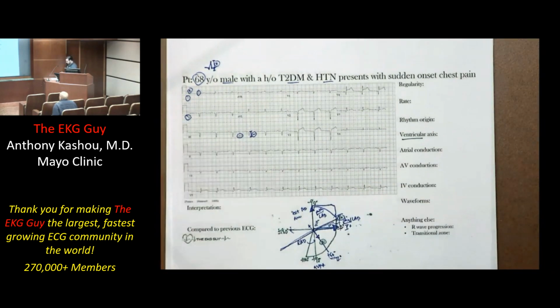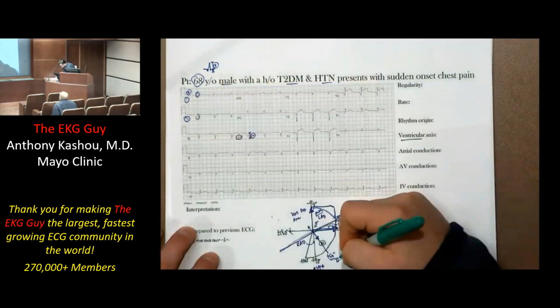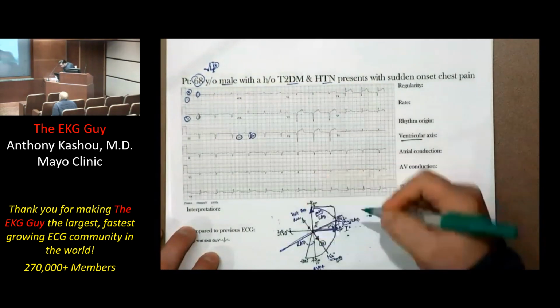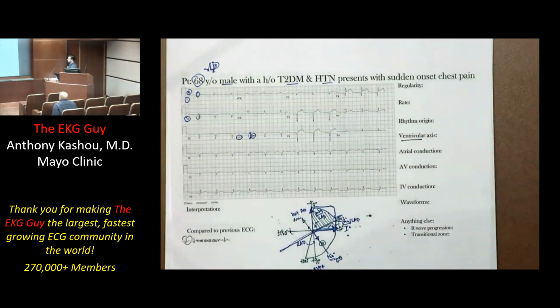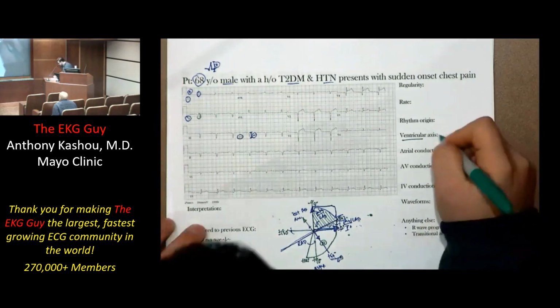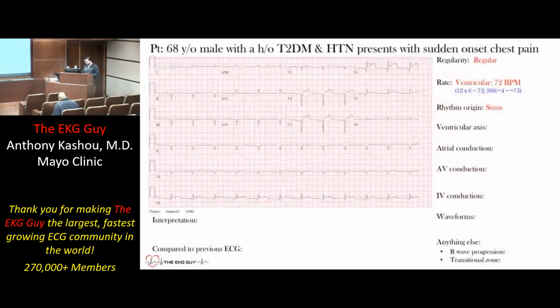So if we look at lead 2, it is mostly negative. So we're going away from the positive end in this direction, which puts us in this region here. And that's what we call a pathological left axis deviation. So we do certainly have left axis deviation here. Does that make sense? I know people were having trouble with axis at our session, and you can see here it is negative 76 degrees. Does that make sense?